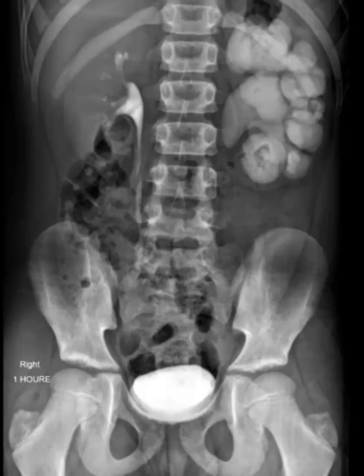Can you trace the contrast further from the pelvis downstream? No. So this is a common day question. It is a PUJ obstruction. Most of the time, multiple patients present with a stenosis, stricture, and this problem. So here is a dilated renal pelvis on the left side with dilated calyces, no or minimal dilatation of the ureter, and abrupt narrowing at the PUJ. So it is a too much delayed drainage. So we have a diagnosis of pelvic ureteric junction obstruction.